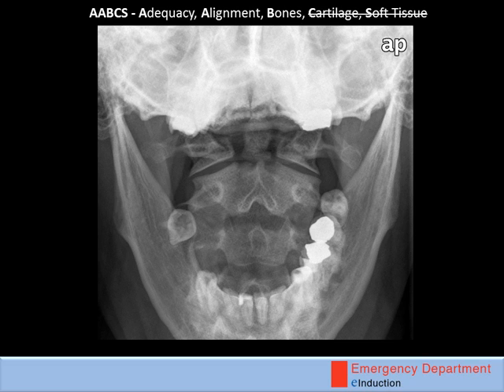The lateral bodies seem to be in the normal alignment. There's a hint of an overhang on the right, but it's likely secondary to a little bit of rotation. When you go over the bones, however, you should see that the dens has a radiolucent line at the base. This is a type 2 fracture and unstable. If the patient is presenting following acute neck injury, then this patient needs immobilisation and discussion with the spinal team.